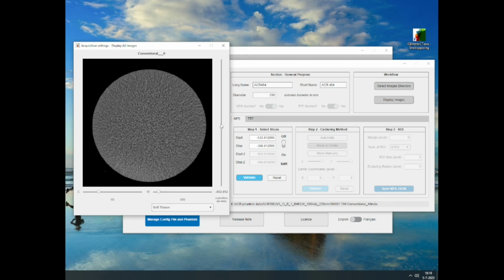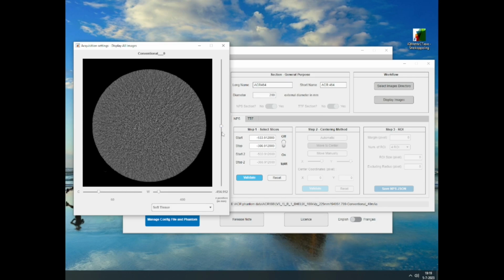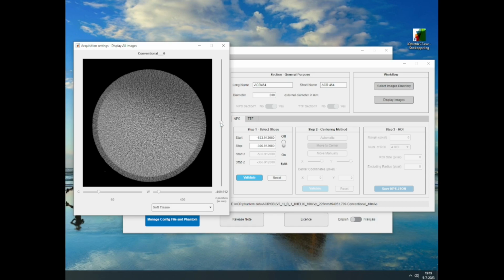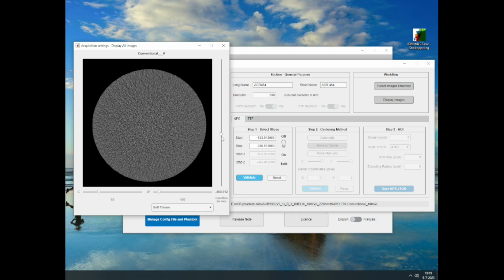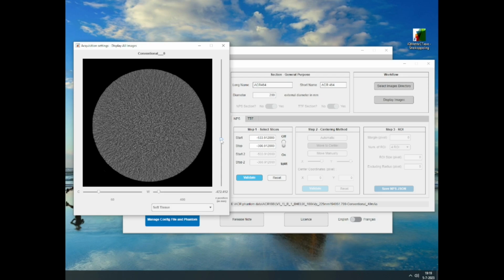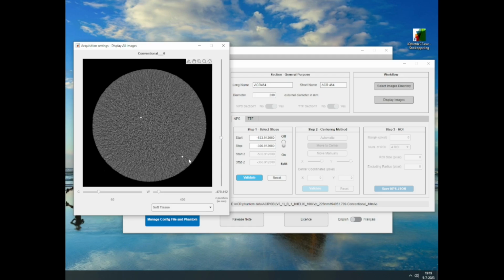Alright, I want to show it. Where is it? There are 2 of these beads in this module, module 3. Yes, right there. That's what I needed. Right here, in here you see 2 beads. When we're going to do this analysis, these are the slices that we basically want to skip.